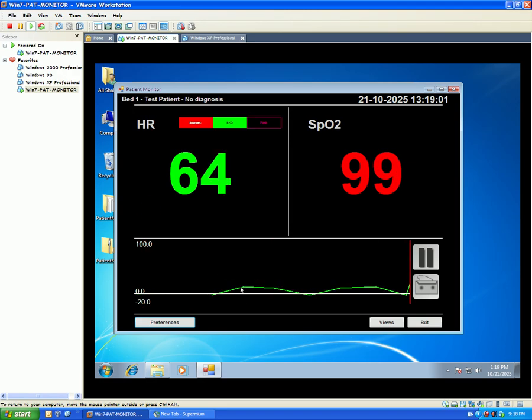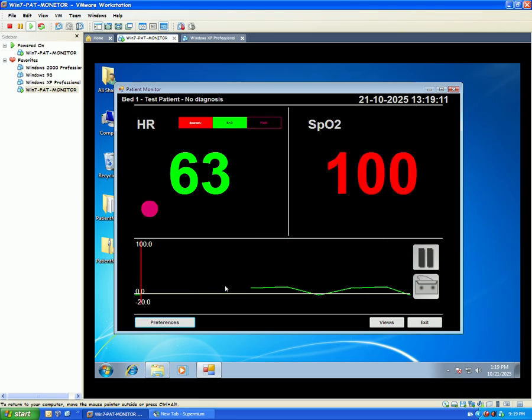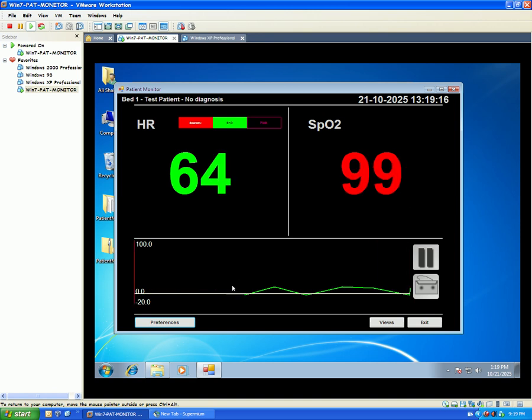Yes, obviously. Oh, now I know it. It's not that. It is VFib or fine VFib, but I think that is fine VFib or even asystole. I think.